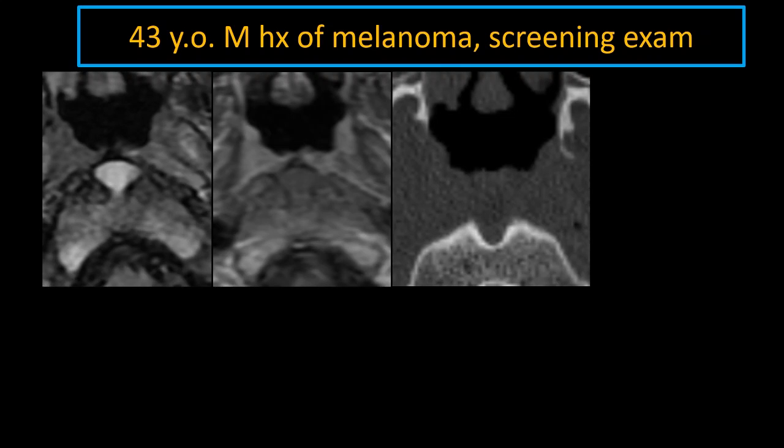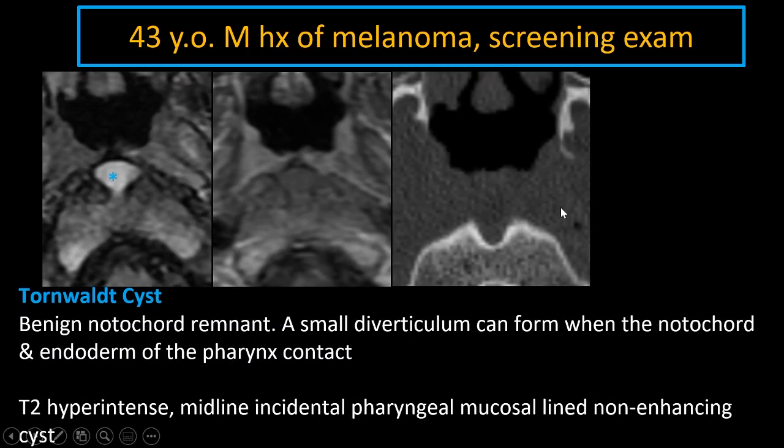In this 43-year-old male with a history of melanoma, we can see that there is a small T2 hyperintense cystic lesion with a notch-like defect associated with it along the anterior inferior margin of the clivus, and that the cyst does not enhance. And this is a nice example of a Tornwaldt cyst with an associated fossa navicularis magna.